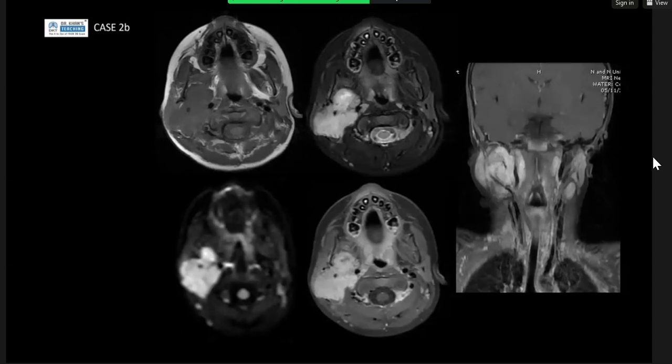However, this is bilateral, seen on both sides. In this young age, I will worry about tonsillar hypertrophy. If this were an adult, I would suspect nasopharyngeal carcinoma, and this could be metastatic lymphadenopathy from here. Or a salivary gland tumor, but I'm considering the age of the patient. This patient is 5 years old. For 5 years old, I will exclude the neoplastic cause. I will go more with lymphoid hyperplasia or inflammatory causes, and this could be lymphadenopathy from this one. Okay. So this was a rhabdomyosarcoma.